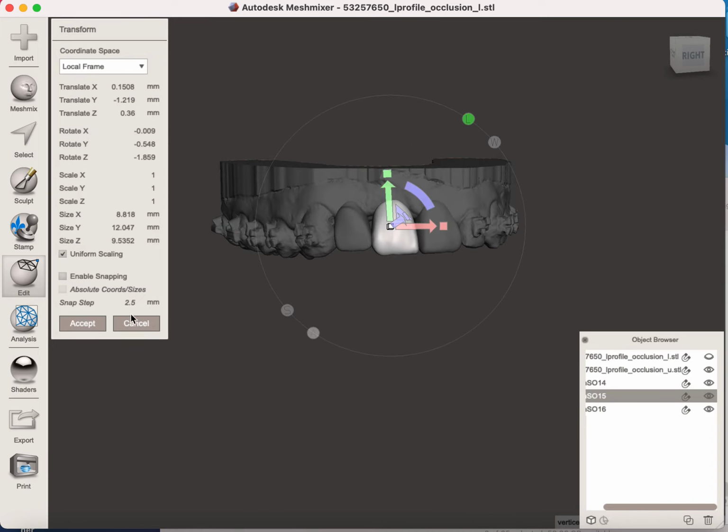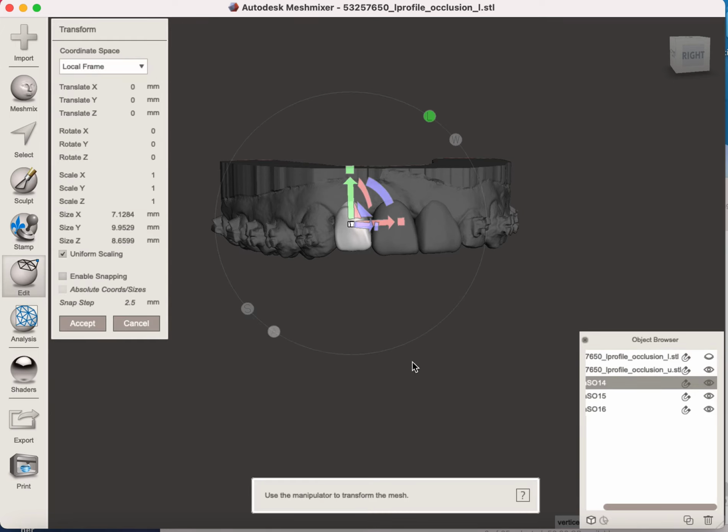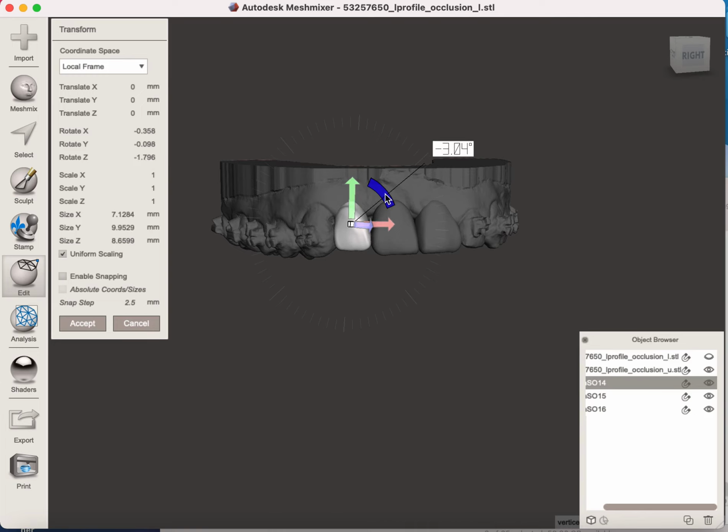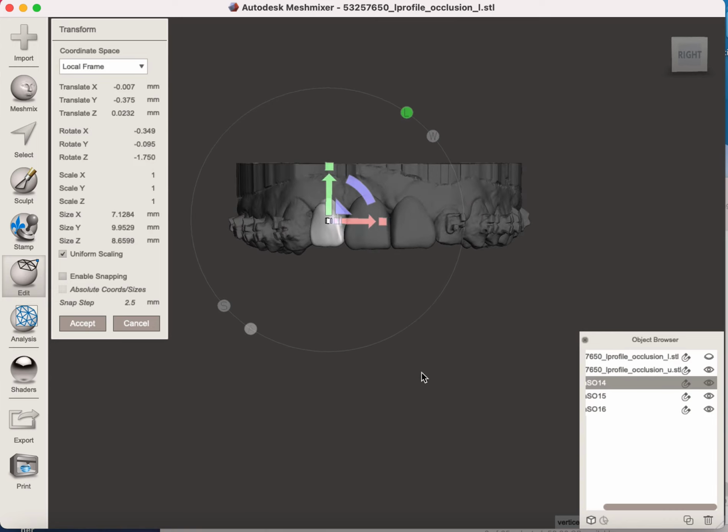There's a lot of other things you can do. You can use some of the carving tools to change the contour of the teeth. I just think that's a lot of extra work for a retainer. I'll let the prosthodontist tweak with that.